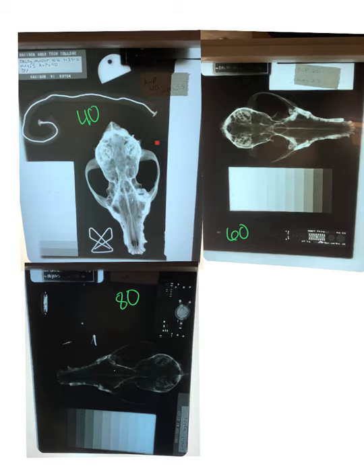And if you look at the skull, here we have a very white skull. We increased our force down here again. You can see how quickly the skull goes from something nice and bright white, to darker shades of gray, to something that's almost completely black. So this is what's happening when we're just changing our force. Same number of x-rays hit all these, we just changed the penetration power, the kVp, the force that those x-rays were coming out of the machine with.